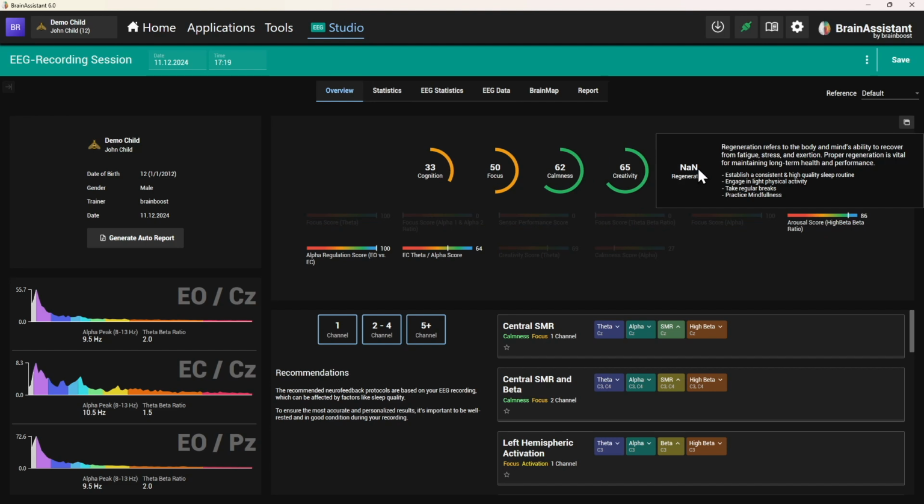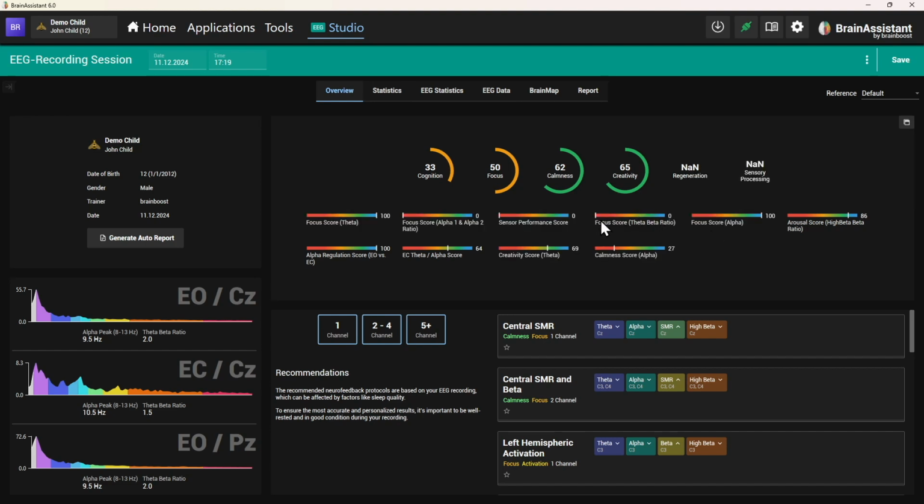This is important, of course. At some point, we also need to say, if you only have 1, 2, 3 of those subscores, and there's no CPT, there's no Stroop, or there's not even enough EEG recordings, then maybe it's only possible to calculate 4 out of these 6 categories.